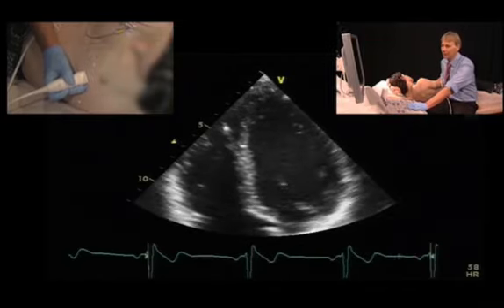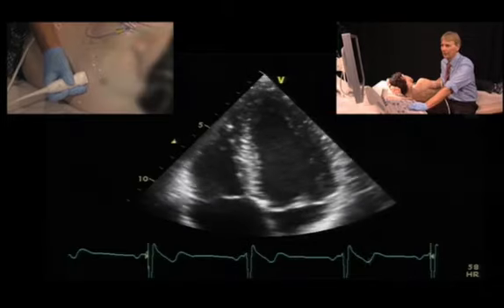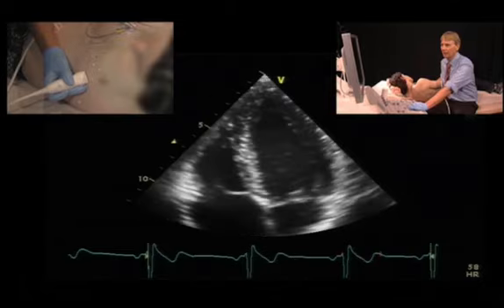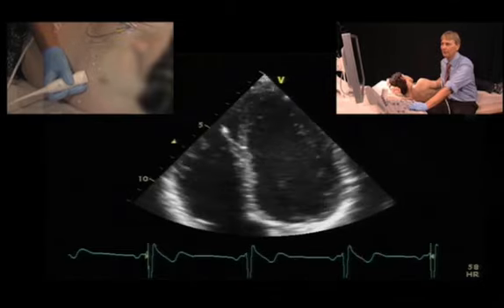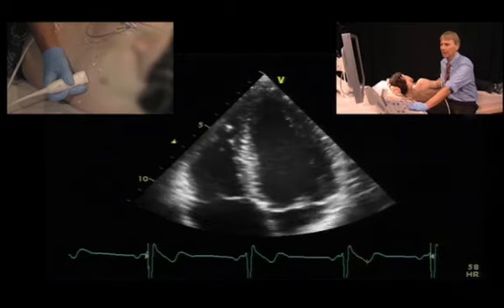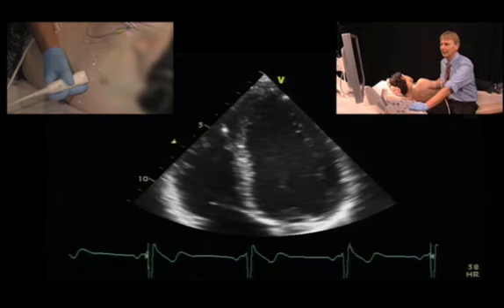Now sometimes we have difficulty to really determine where the endocardium is. It's usually easier if you move the trackball and the frames back and forth, because you can appreciate the contours better in a picture that is moving. And if you remember where the contour is, you will find it easier to track the contour then.